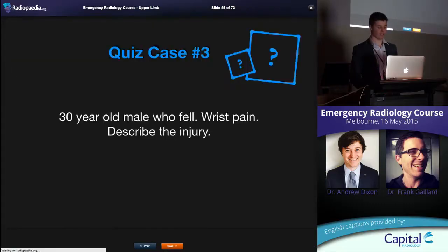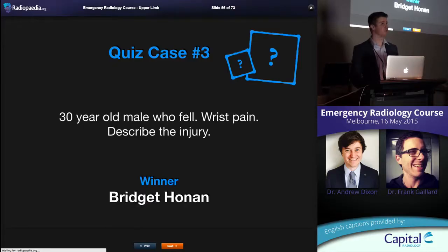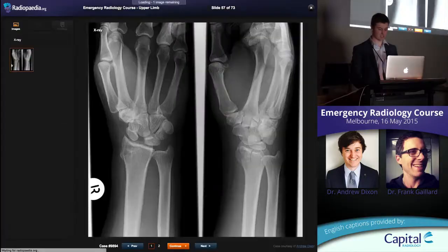Quiz case number 3, 30-year-old male who fell and has wrist pain. Describe the injury. Bridget was the winner. Is Bridget here? Does Bridget want to come down? You get a prize. Yeah, she's coming down. I'll start going through it.